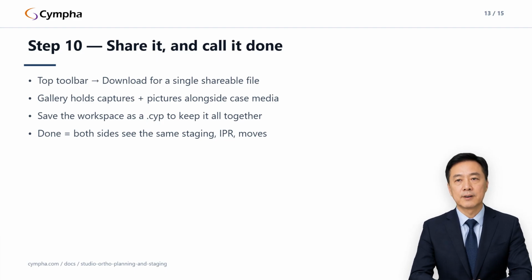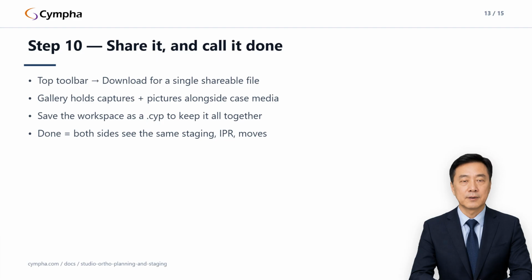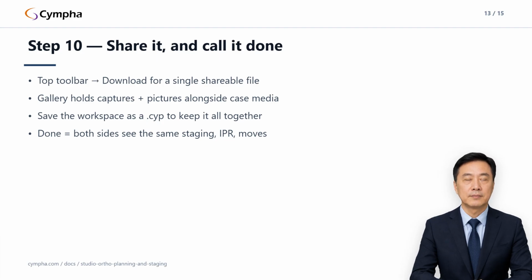Six complaints cover almost every support thread on this workflow, so let's do three and three. First, the movement chart and IPR icons simply aren't showing. Two possible reasons, and check them in this order. They're desktop only and need a viewport of about 1024 pixels or more, so widen the browser window or move to an external monitor. If they still don't appear at full width, the case isn't a guide me or review file. Step archives don't expose those controls at all.